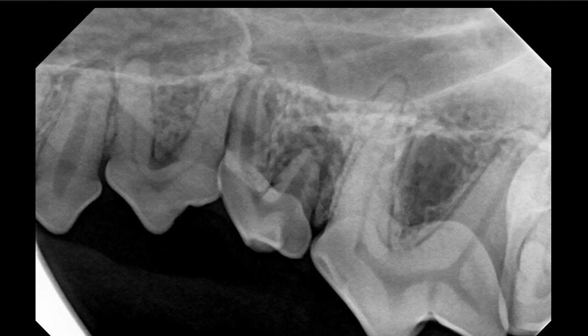Pretty obvious, huh? You've got a really large pulp cavity diameter in that tooth as opposed to the pulp cavity diameter in the other teeth. You do have a large pulp cavity diameter in that first premolar there as well. And if you look around that root tip, you possibly have a lucency there as well that would indicate that that tooth is non-vital. But almost every time that you see that increase in pulp cavity diameter, that tooth is non-vital, and the recommendation is either root canal or extraction.